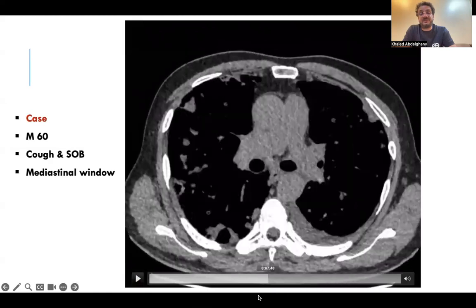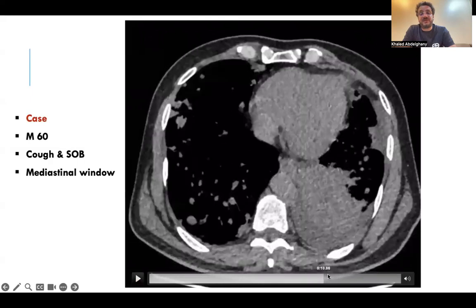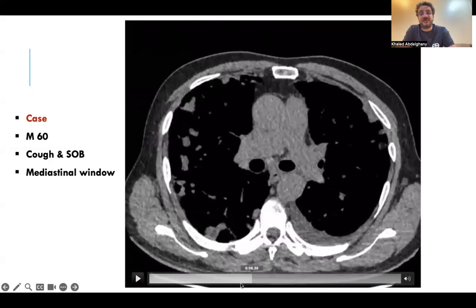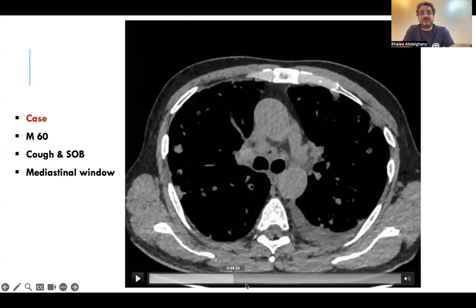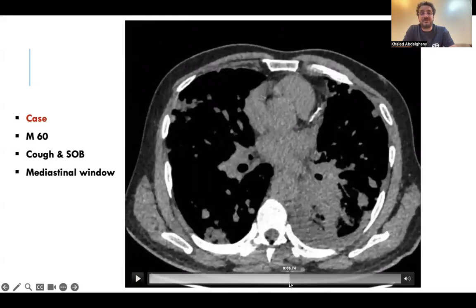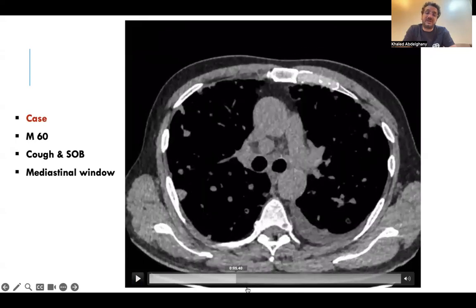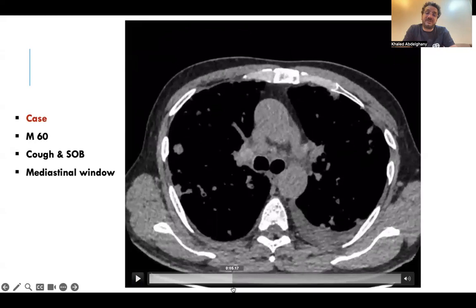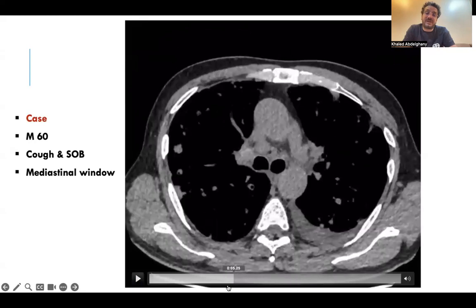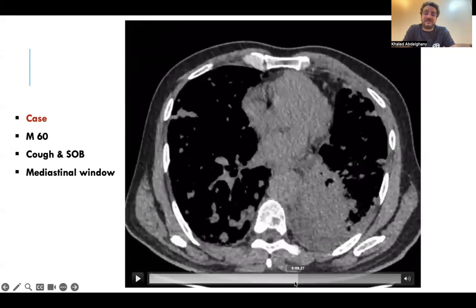They have a tendency to involve the mediastinal lymph nodes with bulky nodal involvement, but here it's not as large, and we hardly appreciate it. It's hard to assess nodal involvement in a non-contrast study, but we don't have bulky nodes that are eye-catching for us.